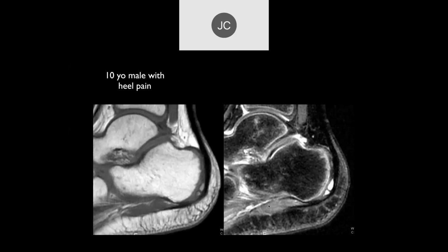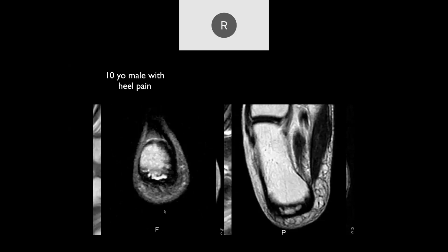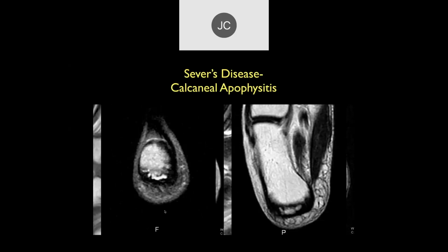So we have a 10-year-old male with heel pain. I think there's some fragmentation of the calcaneal apophysis and maybe some edema within the fragmented apophysis. So maybe some Sever's disease here. And then here are the axial images. We can see that back in through here.